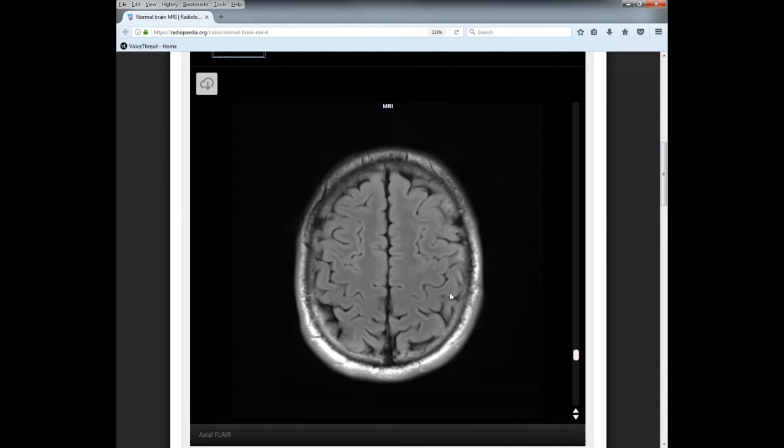And we're going to switch back and forth, seeing different anatomy in different ways, where I will require you to know it in one plane and not so much in the other. It's because I picked the easiest way for you to see all of the main points, but maybe not necessarily in all different planes. You guys aren't radiologists, you're going to be technologists, and we just need to know the anatomy for our purposes. So let's switch over.